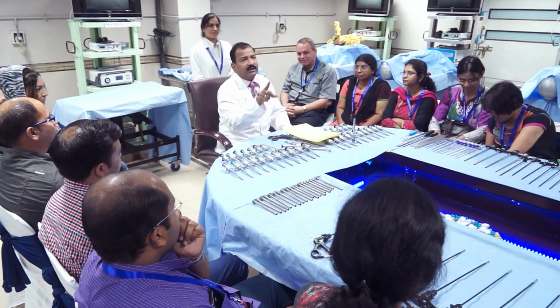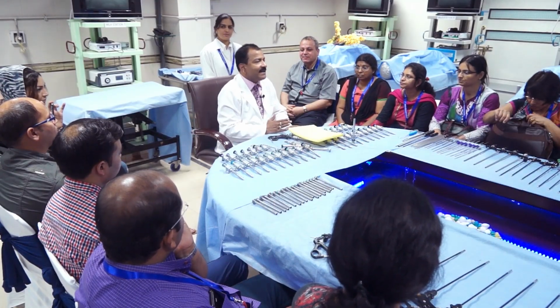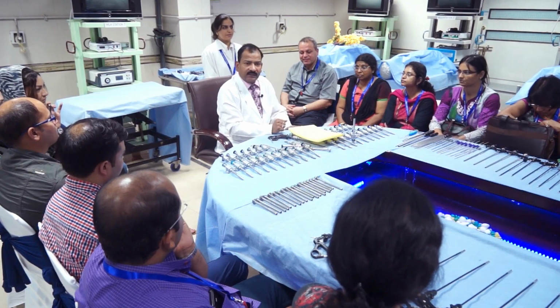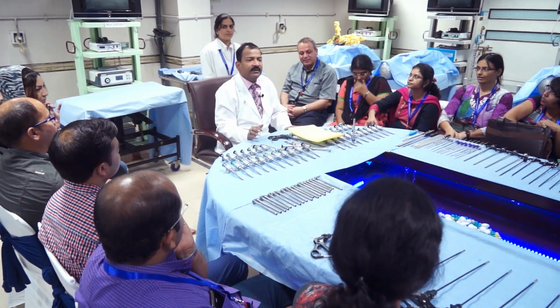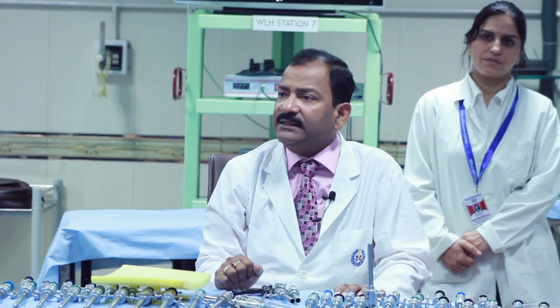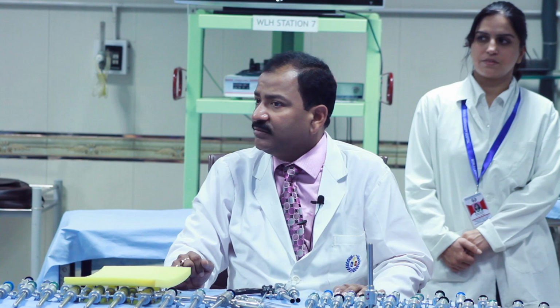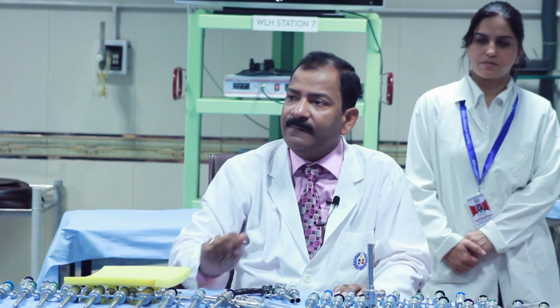So on the OT table, when you are positioning for surgery, you should always stand opposite to the pathology. If the ovarian cyst is on the left side, you should stand on the right of the patient, which we sometimes do not do. In many operation theatres, our trolley is fixed, our instruments are fixed, and then we struggle with bad ergonomics, because you are not changing your place to do the surgery. You are standing at one place only, that is bad.